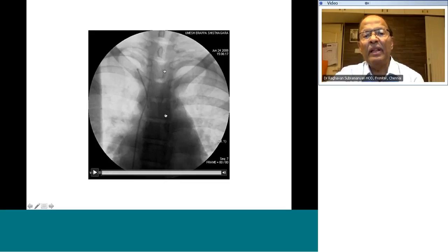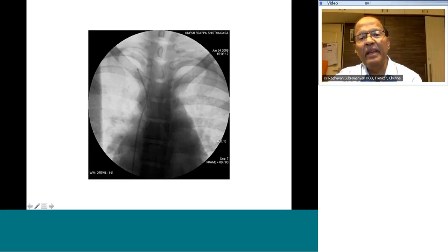Now, when you get a small collimated area, how do you identify AP view? Now, angiogram is always an AP view, never a PA view. If you notice in the cath lab, the X-rays always come from behind the patient, and the image intensifier is on top, right?